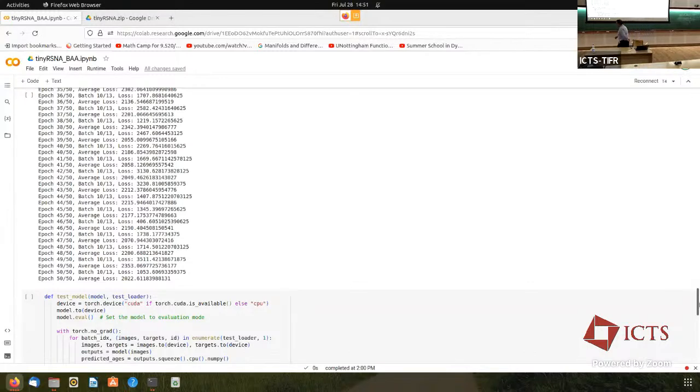Loss is the cumulative loss on all the data in one epoch. It will be the difference that you compute between these 2 points on everything in the data set. So if I get a prediction of 123 on an image that's 120, my error is 3, I square it, I add it up for all the points in the batch, in the entire training data set, take the square root, that's my MSE loss.